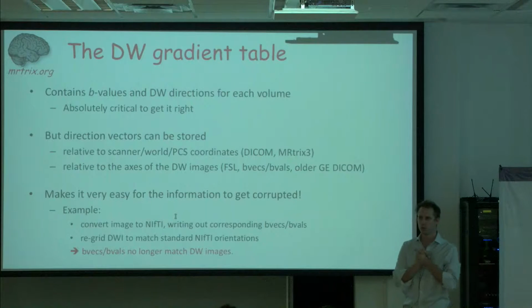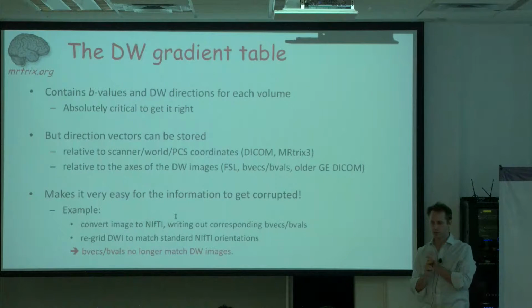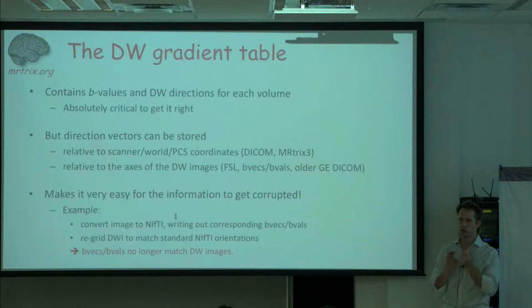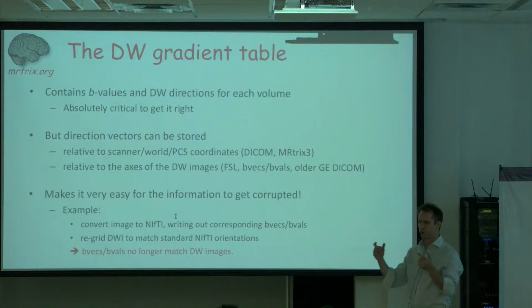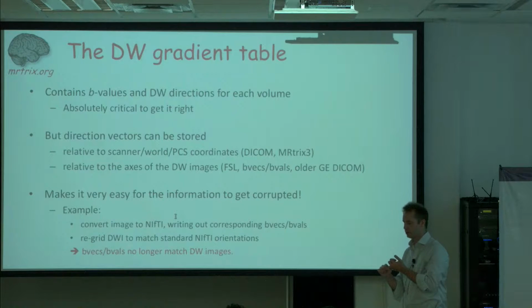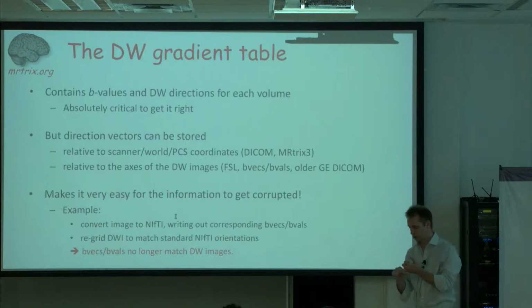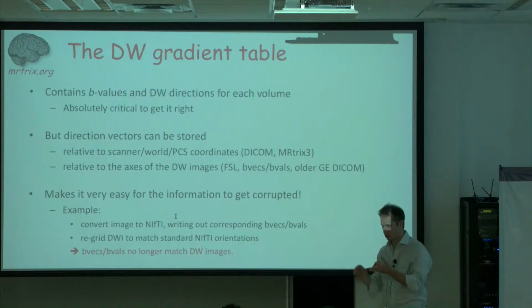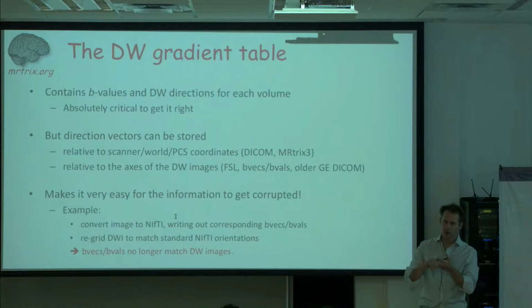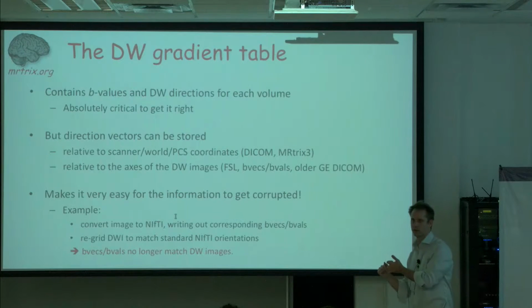We try and take care of all of this for you. But for example, on the Siemens scanner, the gradient directions will be stored relative to the DICOM standard coordinate system, which is NIfTI, but with X reversed and Y reversed. On a Philips, it is the DICOM standard coordinate system. Actually, no, it's always the DICOM standard coordinate system; it's more about what you specified. I'll talk about that in a minute. On a GE system, until recently anyway, it used to be stored with respect to the image axes.